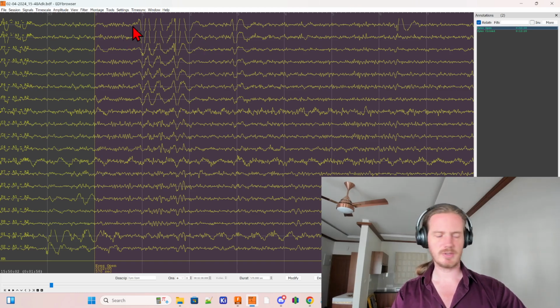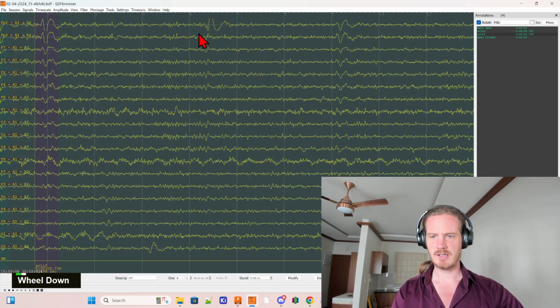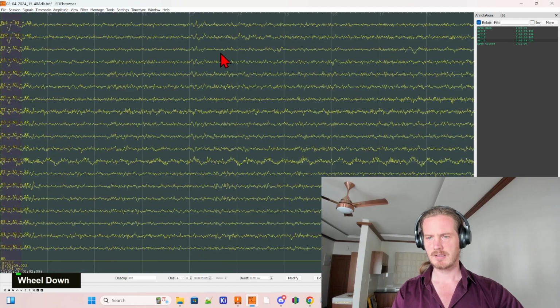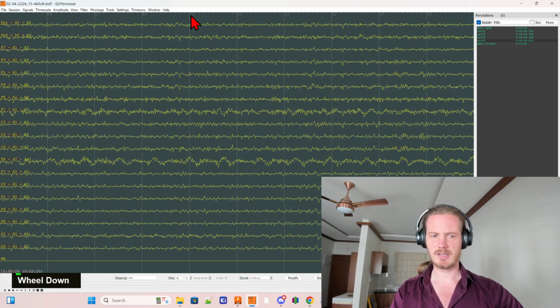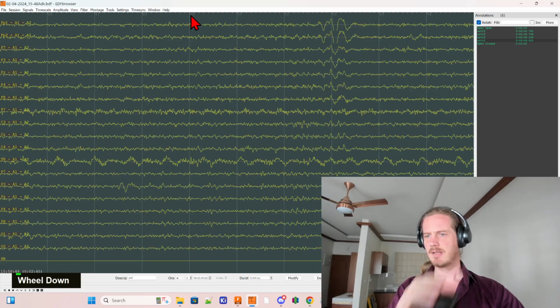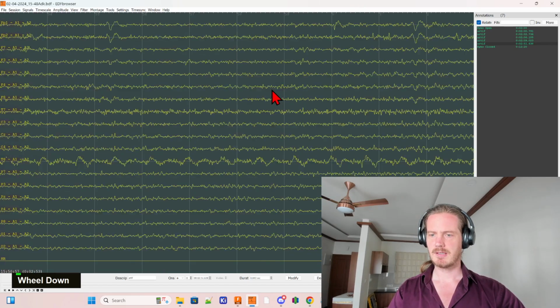And so what I do now is I hold Shift down and I click this, I select this period, and it's an artifact, and this is an artifact, and this is an artifact. It's an eye blink. Scrolling forward. So right now I'm using my scroll wheel to move forwards in time. And here we have an eye blink, so I hold Shift down and I select that period of time. And I'm going very quickly.